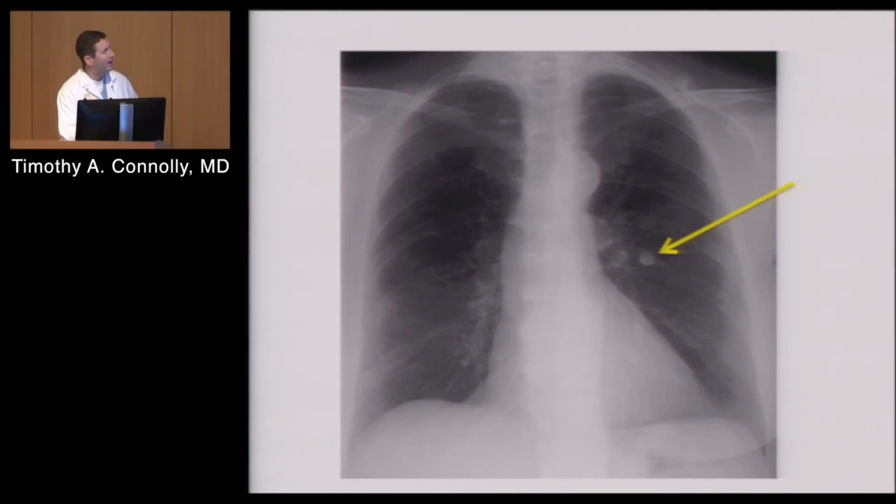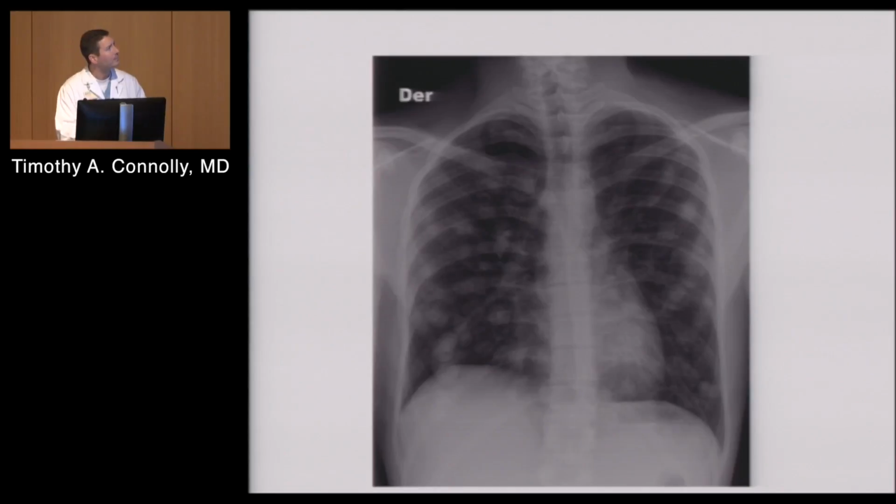Here's an example of a nodule, which is probably a lymph node, which is calcified. You can see it's a pretty good-looking circle there. Now, you can't make too many determinations on a plain chest X-ray other than, again, if this is calcified, which means it's kind of the same intensity and density as the bone, then you can be fairly calm that it's going to be a benign process. The fact that it's nice and circular, we'll go into more detail with CT, but that's a good sign.